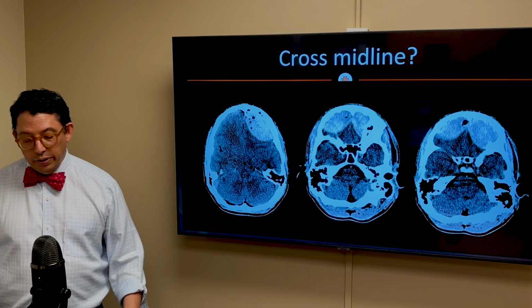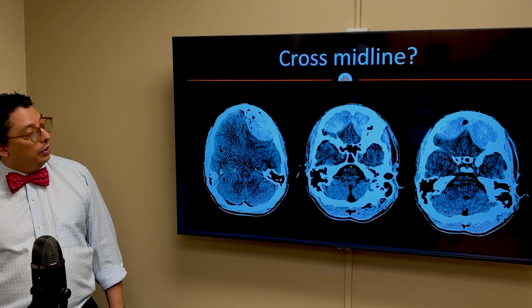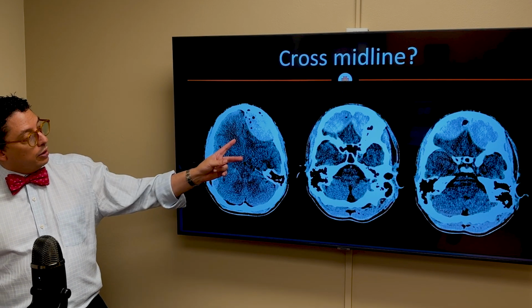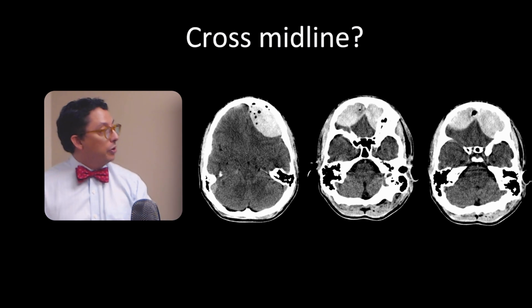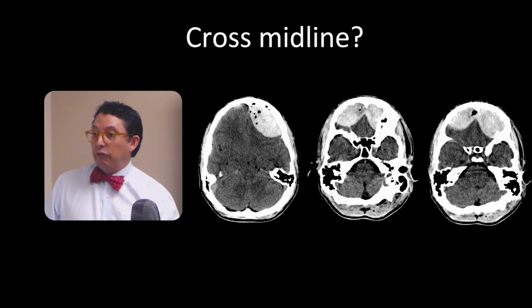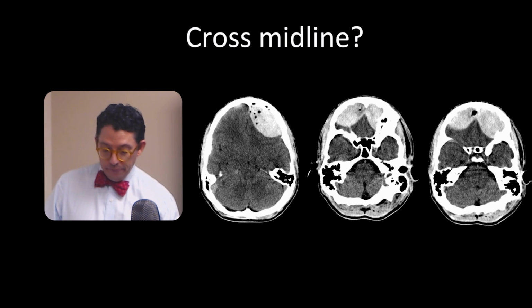This is another epidural hematoma, and sometimes they can cross the midline. Once the metopic suture is closed, they can definitely cross the midline. It's not frequent, but in this case, they did.